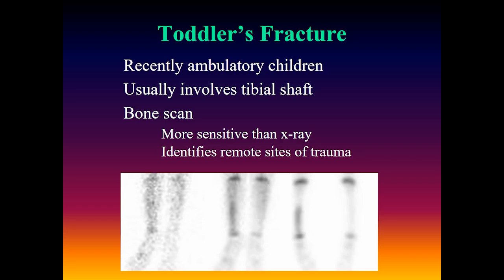Toddler's fractures typically occur in recently ambulatory children. They usually involve the tibial shaft. The bone scan is more sensitive than the X-ray, and as already mentioned, when performed as a whole body scan, it can identify remote sites of trauma.